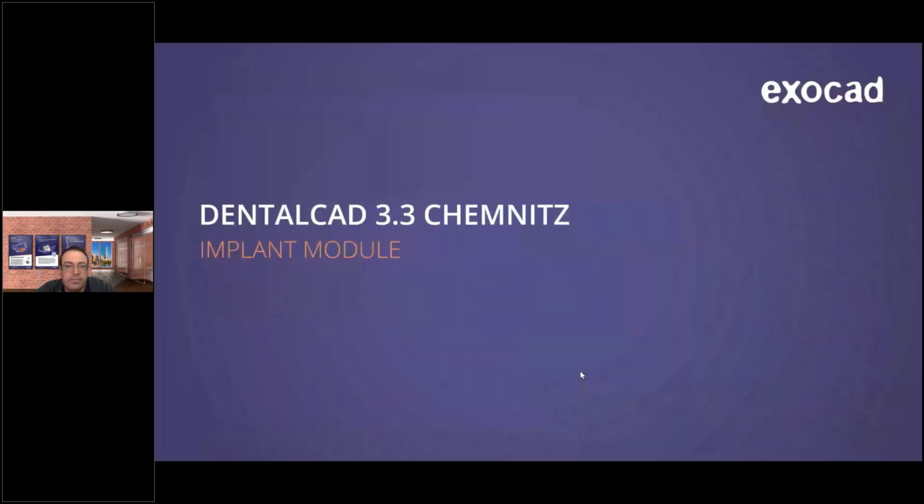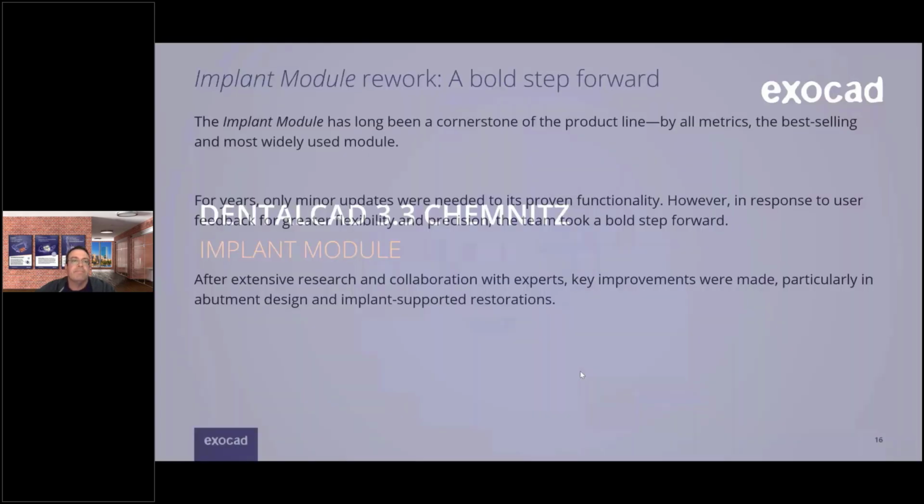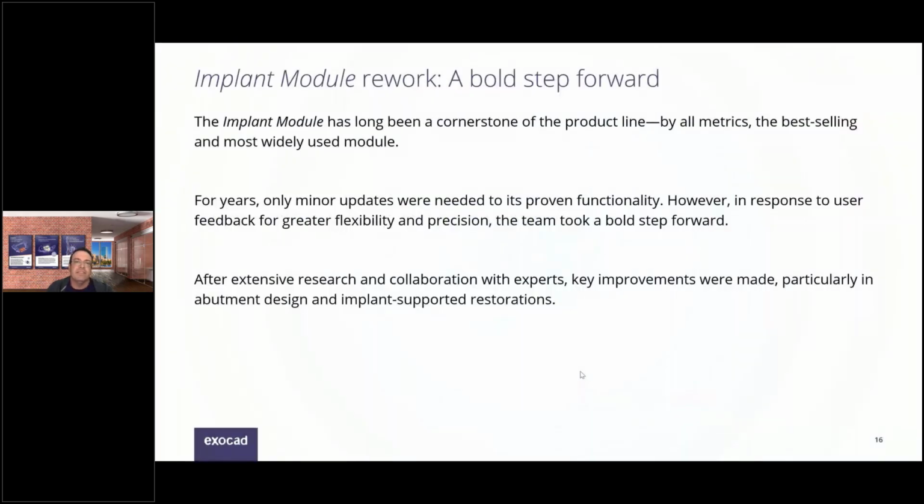Implant module. Let's talk about the abutment design. The abutment module is probably one of the earliest modules in the software, so it's been around for quite a while. It's a super popular module. Over the years, only minor tweaks were made to it, mainly adding libraries.